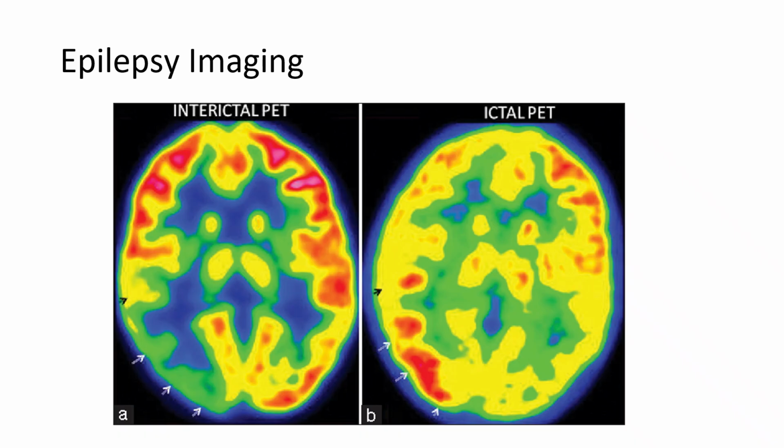This is the same picture again, because I just wanted to revisit that and show you that in this specific patient, notice the interictal, the baseline, it's hypometabolic, and then in the ictal phase, it's hypermetabolic. Image A is really just a classic representation of the interictal. And this is pretty typical of what an ictal scan would look like and how that's then used for surgical planning, because the doctors can see what area of the brain is causing the seizure.